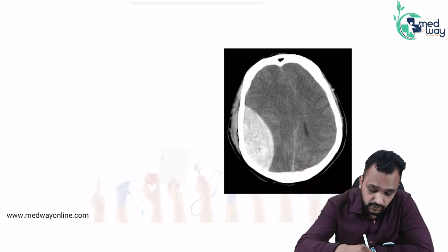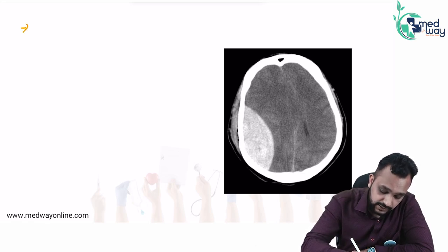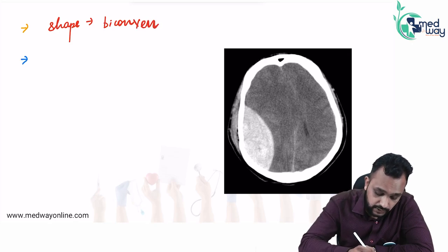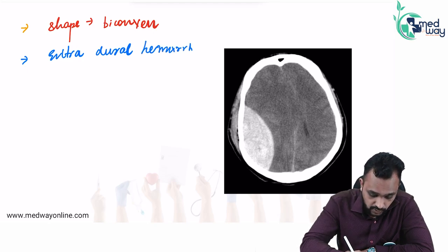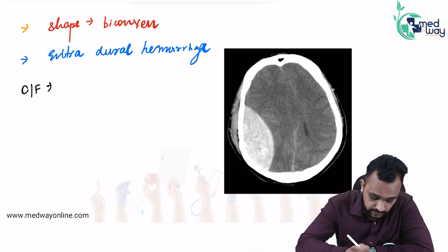Talking about this patient, we can see that in this case the shape of the bleed is biconvex, and a biconvex shaped bleed, I have already told you, is seen in patients with extradural hemorrhage. Now we should know the clinical features. These patients will present with a lucid interval.